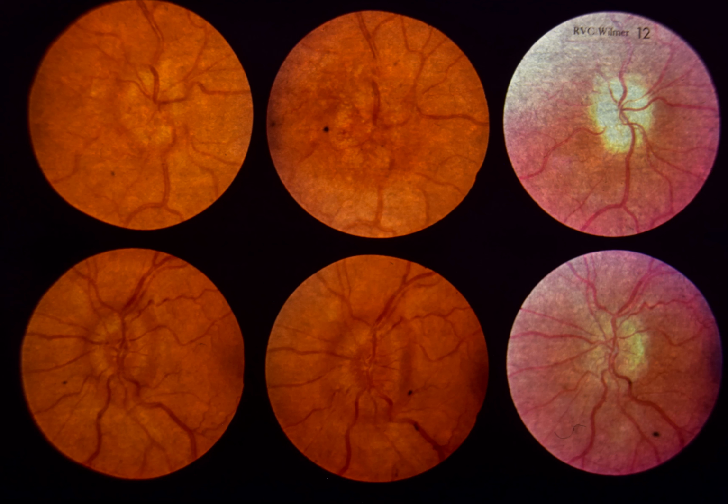Upper left and lower left. The right and left optic discs are edematous, with indistinct margins. No hemorrhages or exudates are present. A neurologic evaluation was normal. Cerebral angiography showed no mass, and pneumoencephalography showed small ventricles, elevated cerebrospinal fluid pressure, and normal cerebrospinal fluid protein.